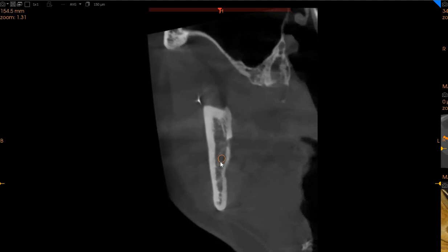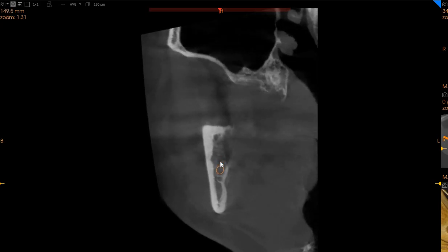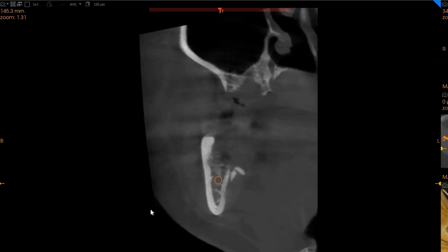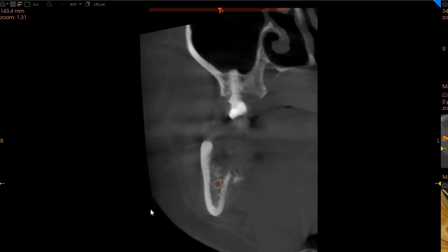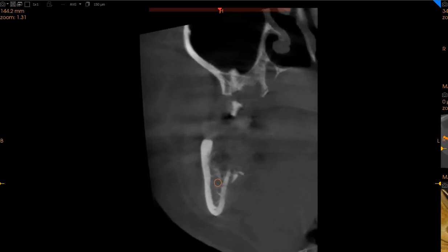Along with that, like we mentioned previously as well, there is displacement of tooth structure or bone in the sublingual spaces, which can be seen right here. This radiopacity is definitely a cause of concern, which can lead to lingual swellings and sublingual bleeding as well. And that is something to be kept in mind and needs clinical correlation.